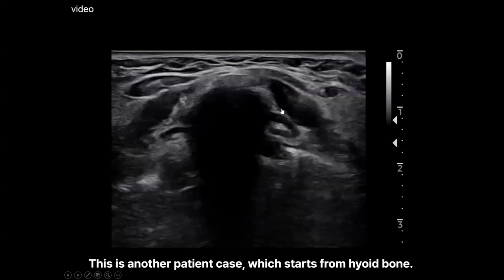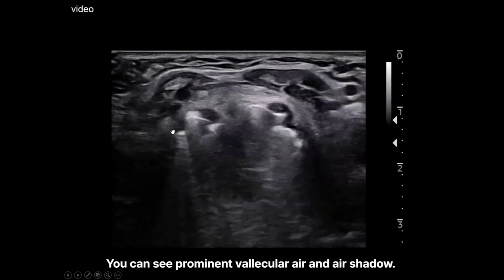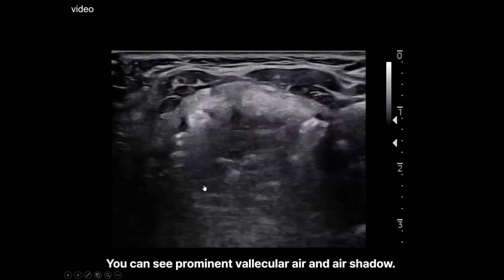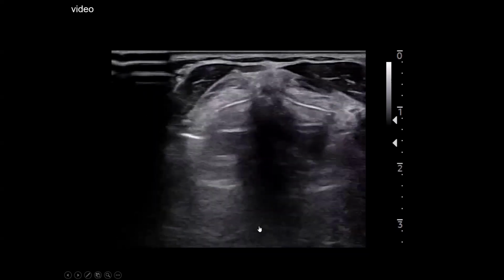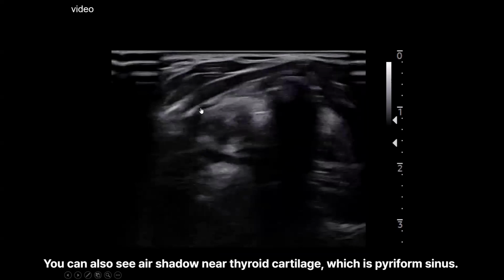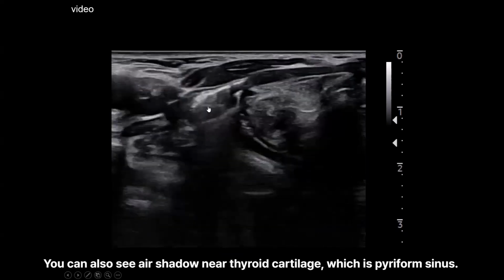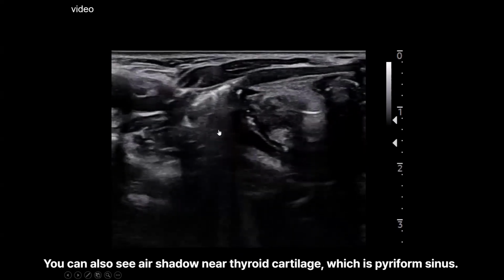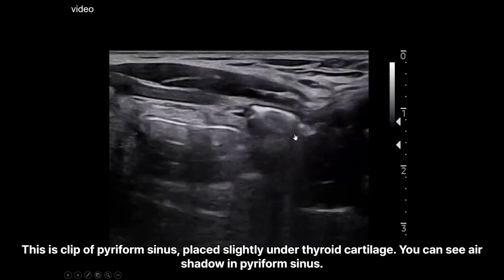This is another patient case, which starts from hyoid bone. You can see prominent vallecular air and air shadow. You can also see air shadow near thyroid cartilage, which is pyriform sinus. This is clip of pyriform sinus, placed slightly under thyroid cartilage. You can see air shadow in pyriform sinus.